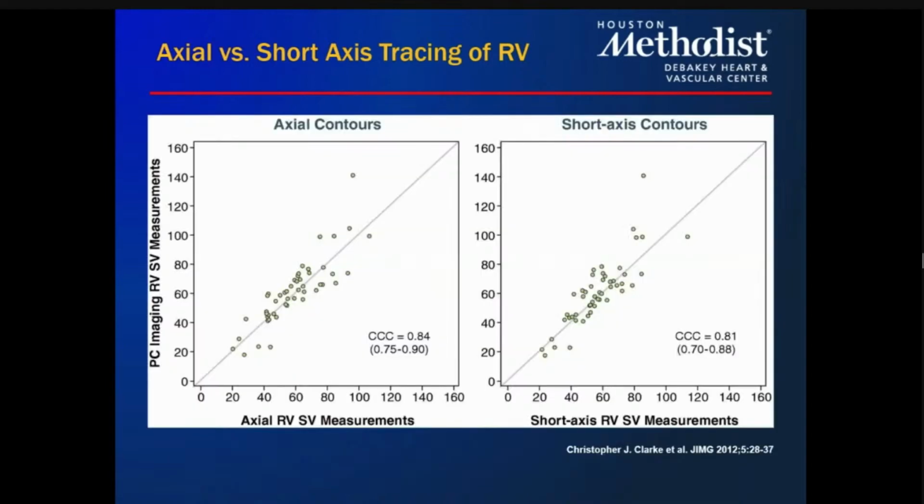This is just showing how the axial stacks that I showed versus short axis stacks compare with phase contrast imaging of the PA stroke volume.